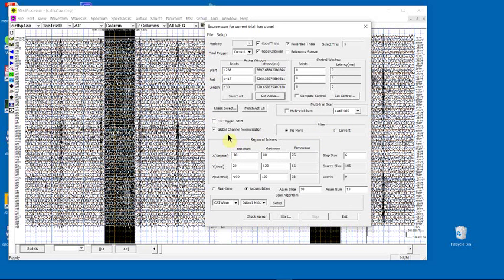After we select the data and define the pre-localization processing, we define the scan region, which we call the region of interest. Typically, we use the default parameters, which basically scan the entire brain. The unit is millimeter. As you can see, X is from left to right, Y is from inferior to superior, Z means frontal to back. Basically, this is the typical size of the brain.